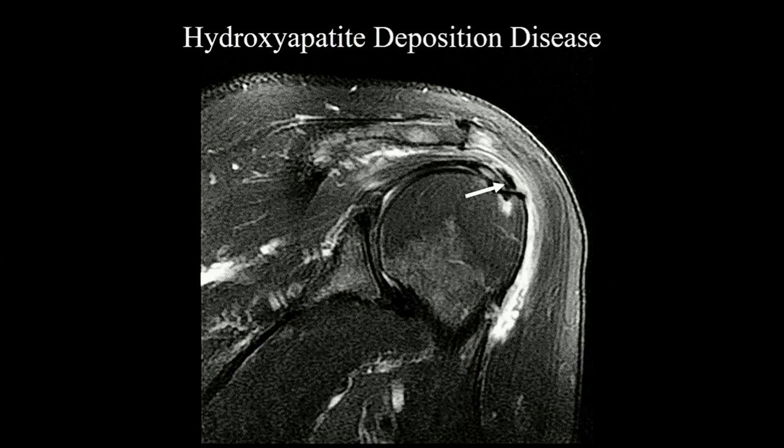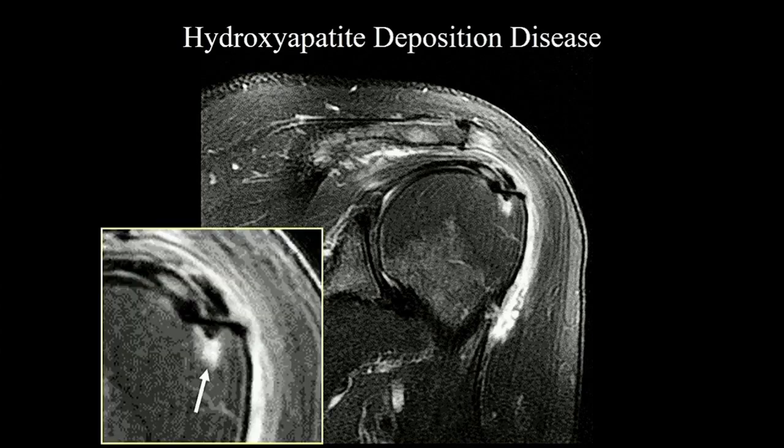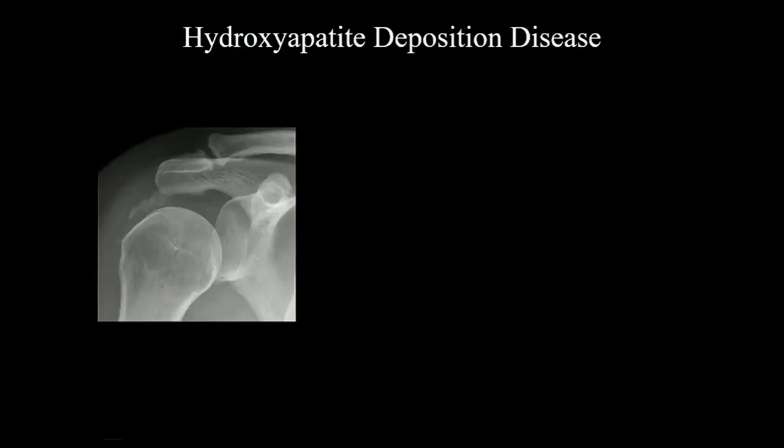And then if you go back to our test question in the second patient, you can see the calcifications and you can confirm those on your PAC system with either a prior shoulder radiograph or look at a chest x-ray. But in this case, we had the very similar bursitis, but we also have some edema within the bone because of the calcification next to it. So they can be very irritating and they can be confusing.